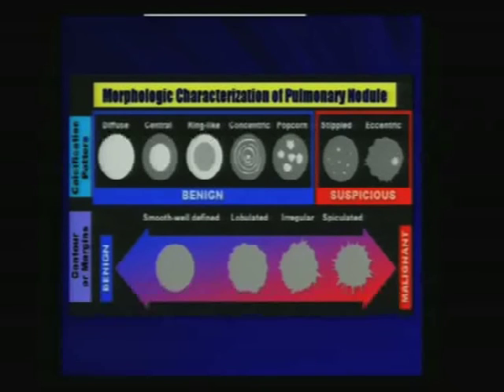We can look at the presence of calcium and the different patterns of calcium, and usually those all mean benign disease, usually granulomatous disease. You have the popcorn calcification, that usually means a hamartoma, but just remember a hamartoma is better diagnosed by the presence of fat. But also remember there are calcifications that do not necessarily mean benign disease, and we may be able to see some examples.